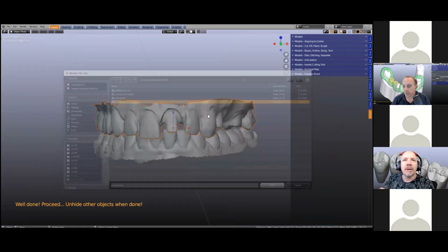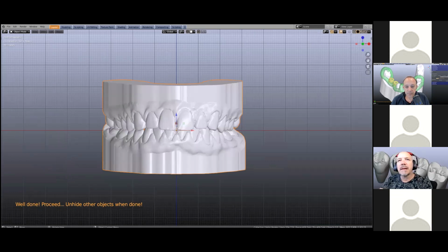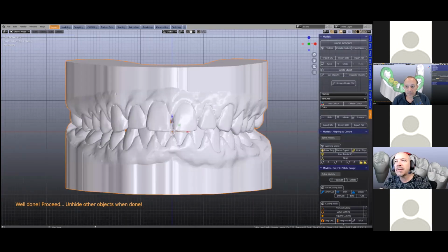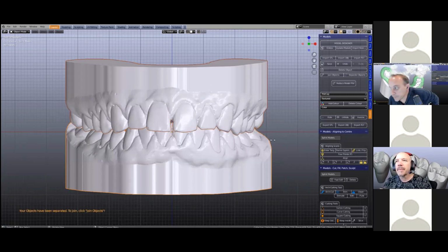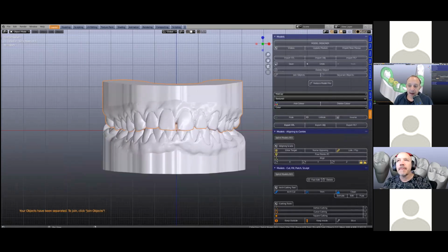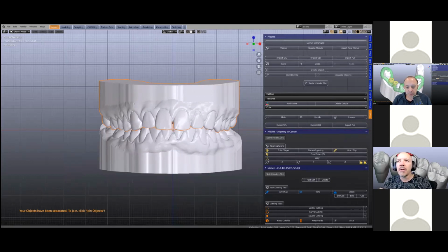All right, study models. Here we go. Just give it a matcap. You'll see that these two are joined. To unjoin them, in the model design, I'm going to click on separate. Can you expand the menu a little, Michael? Which part of the menu, Wolf? Just expand it out. Yeah, like that. Oh, I heard explain. Okay. So study models, we're going to go and name these. This becomes the upper model, and this is the lower model.